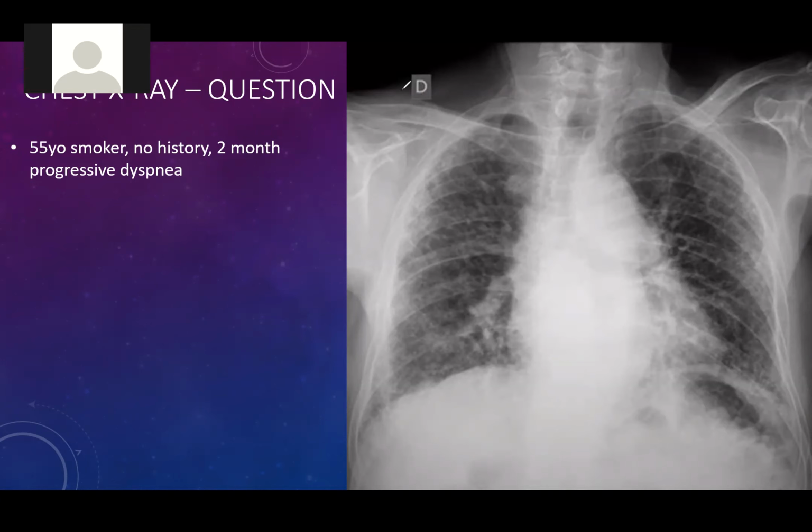What is it like to have COPD actually? For COPD, chronic obstructive pulmonary disease, I have to see the inspiration getting higher, the air trapping inside the lung, right? But when I count the ribs, it ended at the 6th one, and the diaphragms are looking quite curvy, so they are not very flat.